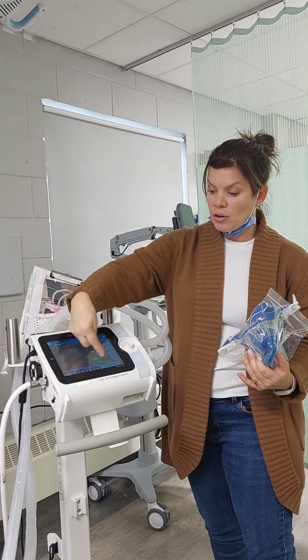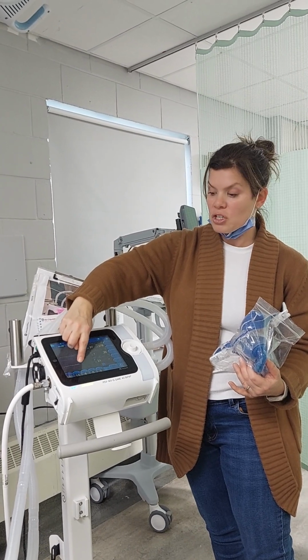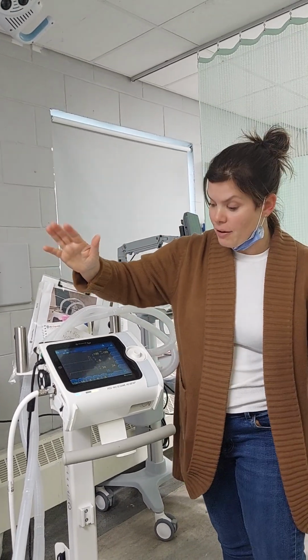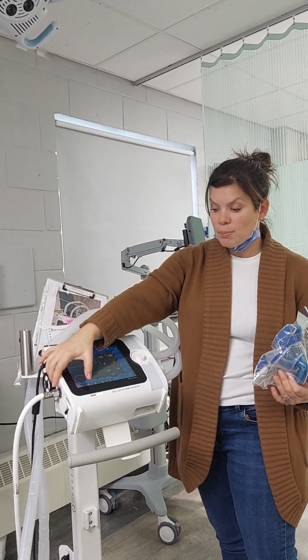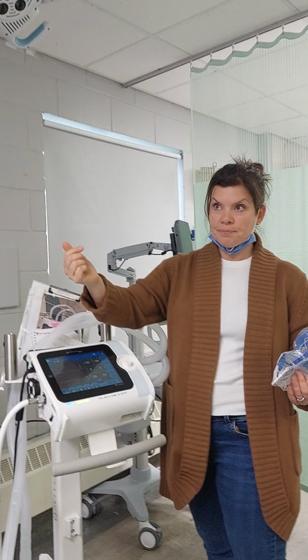You'll see your tabs at the bottom are a little bit different. Your tidal volume is not there anymore. It's just your PS for pressure support. They might do BiPAP 10 and 5. You're changing your pressure support and your PEEP. That's how it's often written. The top number is how much pressure is blowing when they're inspiring, and the bottom number is how much pressure is there while they're expiring. It keeps the airways open.